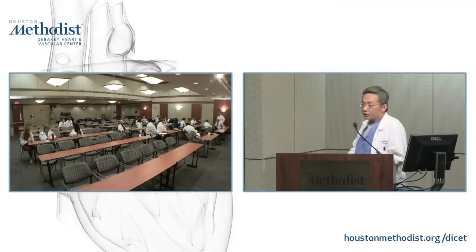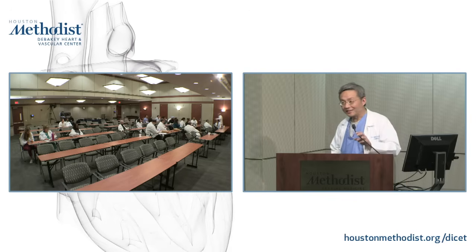Great suggestion. I think that will be a lot easier, and we don't have to scroll through. After all, it is like a stress echo. Exactly. Oh, that's right too, that's right too.